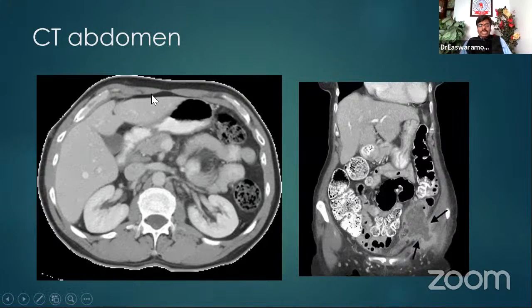I'll try to help you. This is a cross-sectional image, and always you see this is the patient's right side, 9 o'clock. 3 o'clock is the patient's left side. I told you, on the monitor when you put it. Vertebra, aorta, IVC. Okay, in front of the aorta, the first important thing is the left renal vein, and in front of that you see another artery. Okay, that is the superior mesenteric artery. Then another vein, that is the splenic vein. So artery, vein, artery, vein. This is a very classical section right at the level of the pancreas.